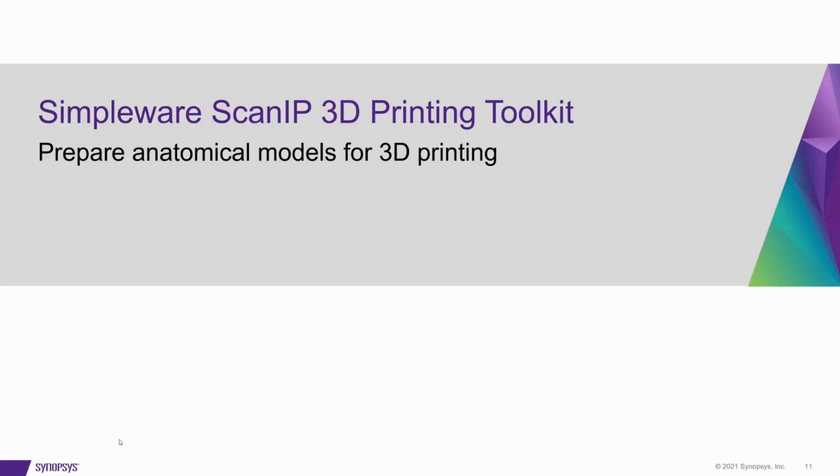So we've taken some tools and customized them towards this 3D printing application. So I'm just going to talk you through those new tools and give you a very brief demo of how they look and work in the software.